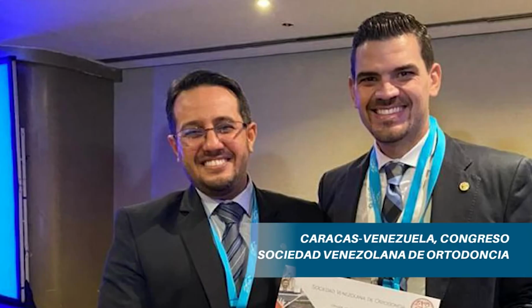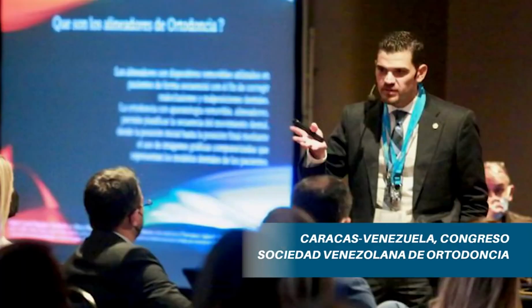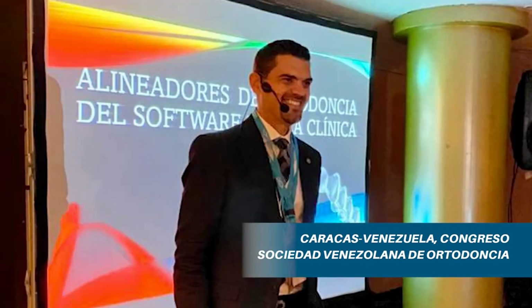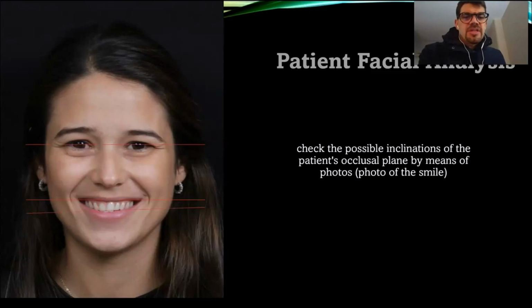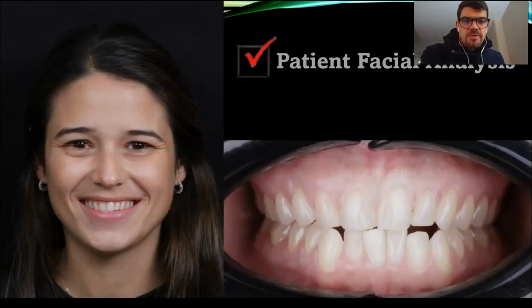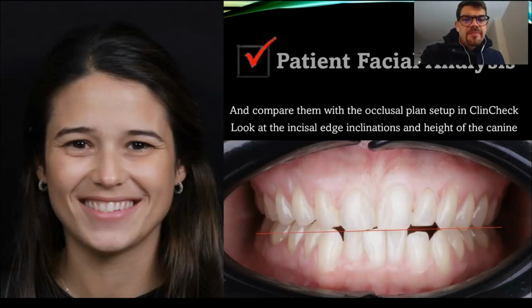When I talk about the previous sector, or anterior sector, I say that for the patient's facial analysis, check the possible inclination of the patient's occlusal plane by means of the photo of the smile, and then compare it with the occlusal plane set up in ClinCheck.